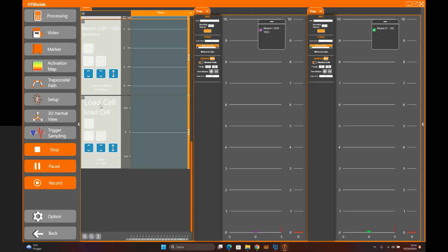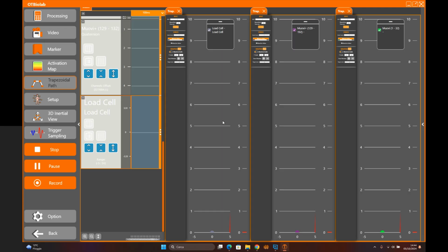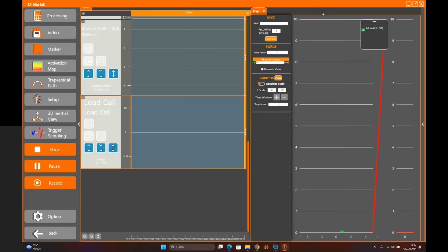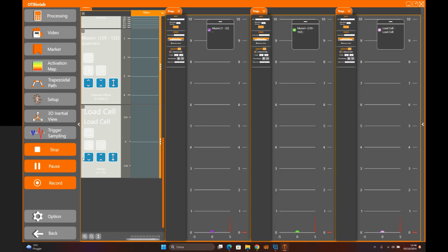And also the last one. So now you have three different and separate trapezoidals. Be sure your computer is not struggling too much, like in my case. Otherwise, it's quite consuming. Okay, this is all for now.